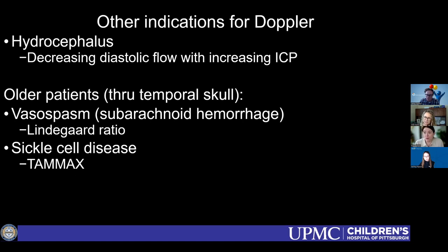So we do have measurements that we give. We do our measurements on the coronal plane, and we do an anterior transfrontal, transoccipital, compare it to transcalvarial measurements. You can actually do ratios. I don't have it offhand, but there's a publication out there that shows that those measurements are the most consistent with MRI measurements. Yeah, there was Rupa, the Indiana group. Yep, exactly. So we do give those as well in those hydrocephalus patients.